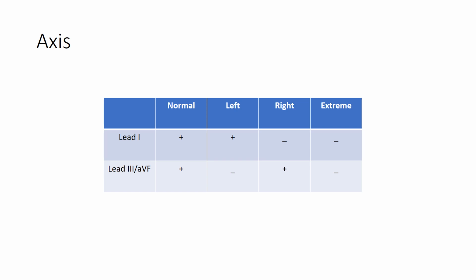This is an oversimplification. Other methods for accurate axis calculation are also available, but for the beginners, we will rely on this table. It's easy to remember.